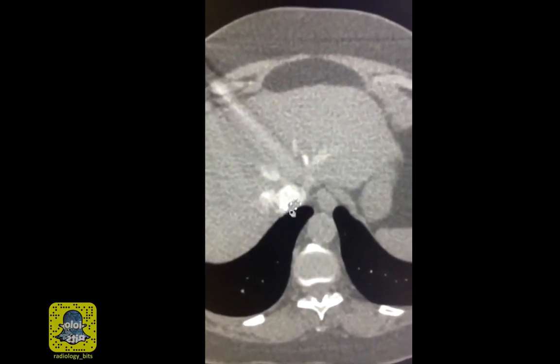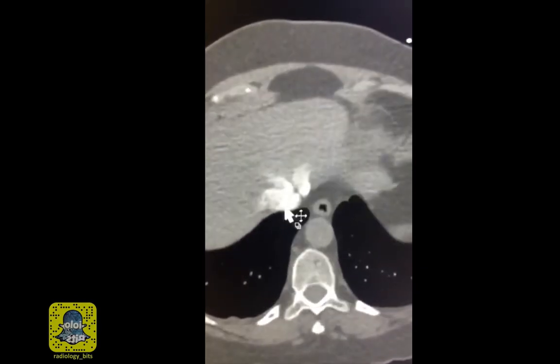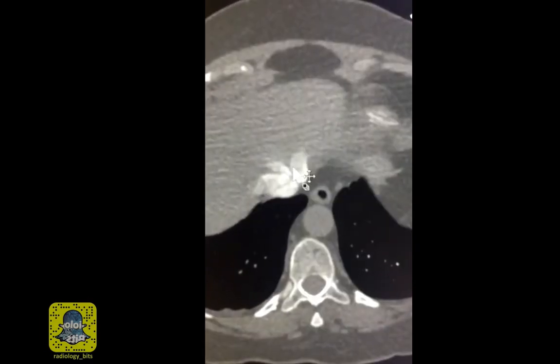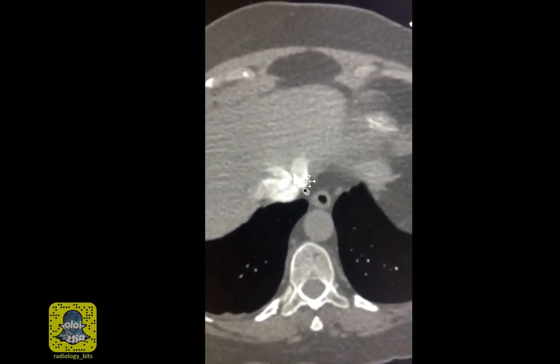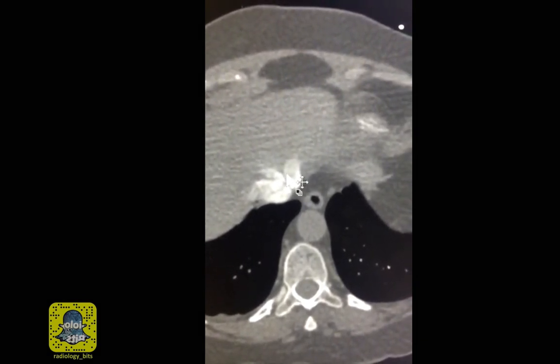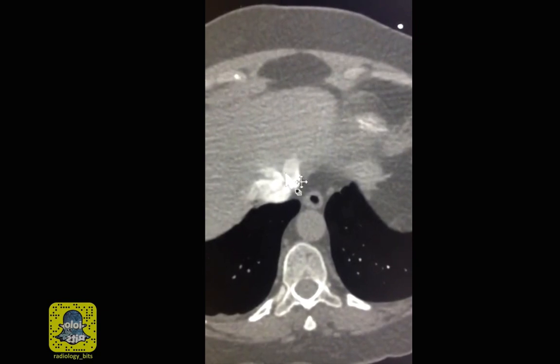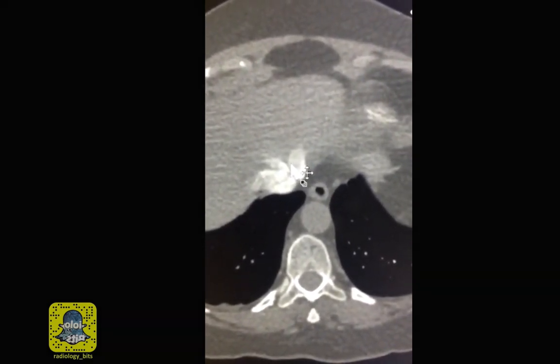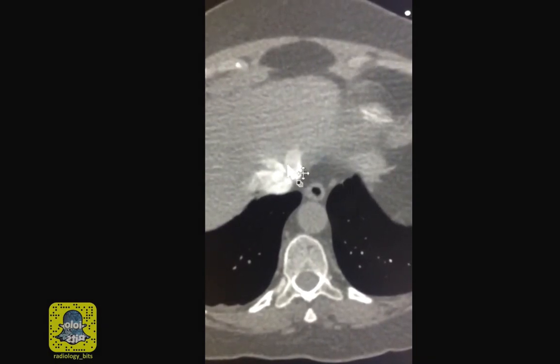Just a note of a pitfall for radiology residents: you may have reflux of contrast without the other features in normal patients. This may happen in a normal patient without right heart strain because we use a power injector to give contrast, and this power of injection might lead to that. So keep that in mind when reading these cases, and make sure if you see reflux of contrast to look for the other features that we just talked about.